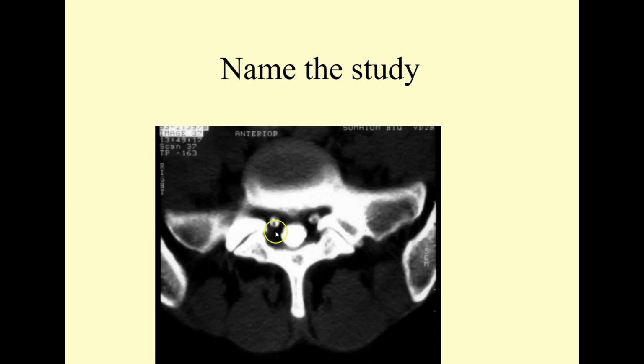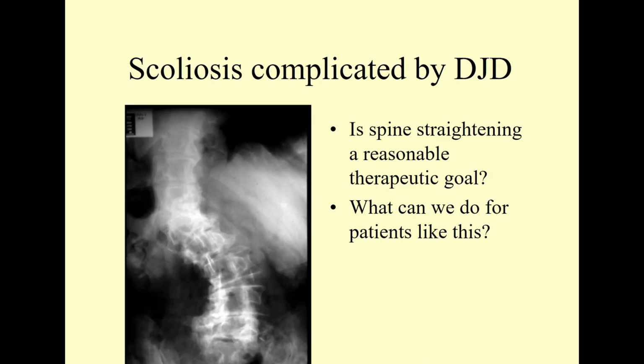And then I also wanted you to see what a normal nerve root encased by the nerve root sleeve looks like versus an inflamed, edematous one that is almost certainly producing symptoms. This is the kind of patient that comes to a chiropractor.